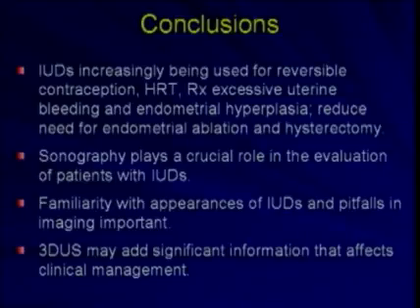Ultrasound plays a critical role in the evaluation of patients with IUDs. It is incumbent upon imagers to be familiar with the appearance of IUDs and the pitfalls in their imaging. And finally, 3D ultrasound may add significant information that can affect clinical management.